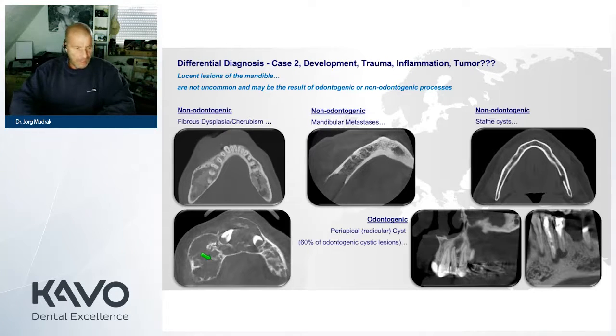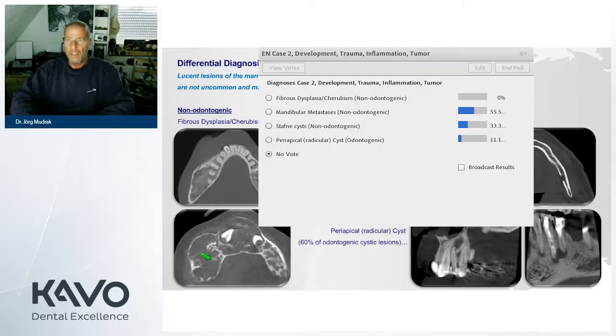Okay, so we've got another 15 seconds. Maybe one hint in the last 5 seconds: the localization is a little bit atypical for that finding. So we have now 10, 9, 8, 7, 6, 3, 2, 1. Okay, so let's see what we are talking about.